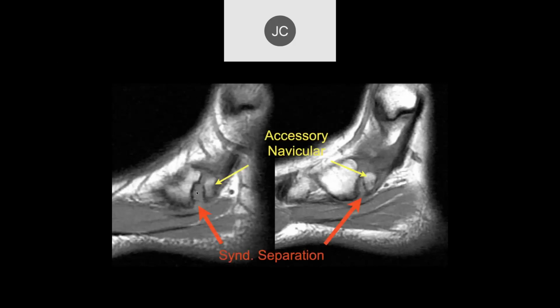And you're right, I think that's an accessory navicular, and there's separation of the syndesmosis between the probably type 2 os naviculare and the navicular bone itself, which can be a symptomatic lesion when you tear that syndesmosis. Good. It could also potentially have been a type 3, where you have an avulsion fracture. But in this case, I think it was believed that this was a retraction and tearing through the syndesmosis, not a fracture of the bone itself.